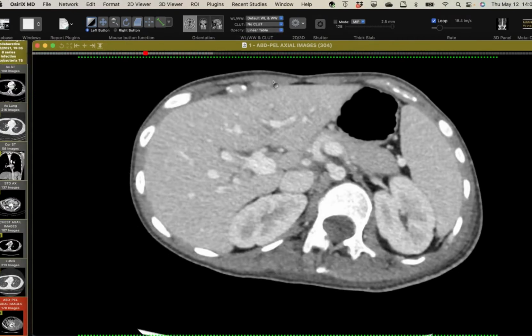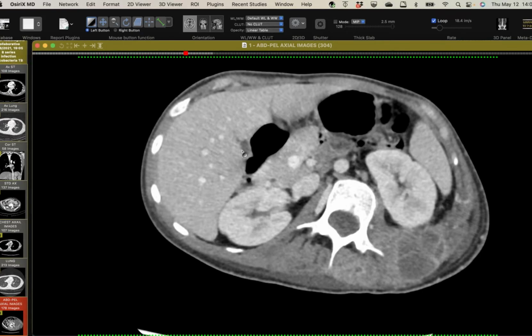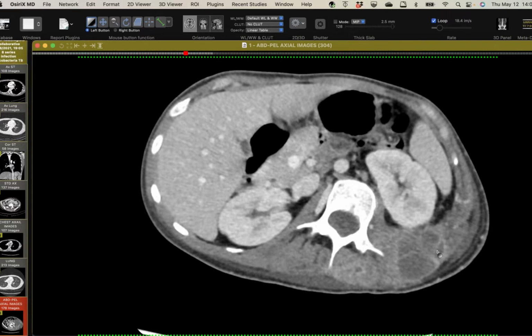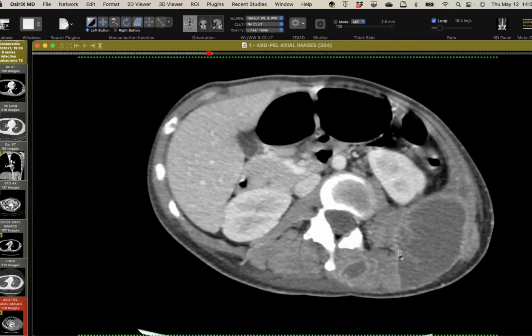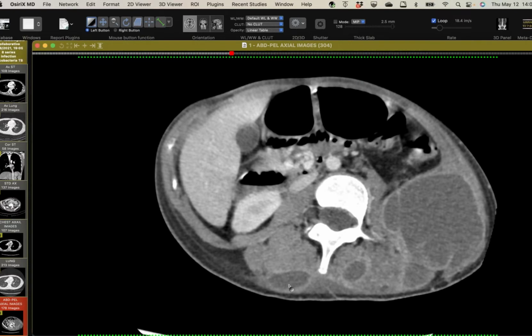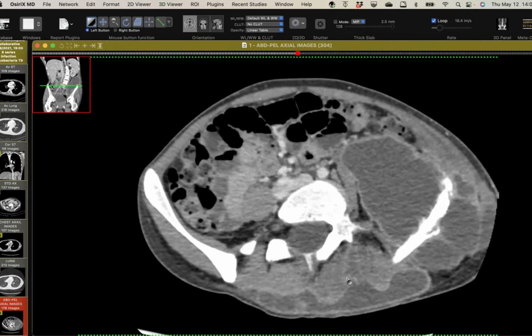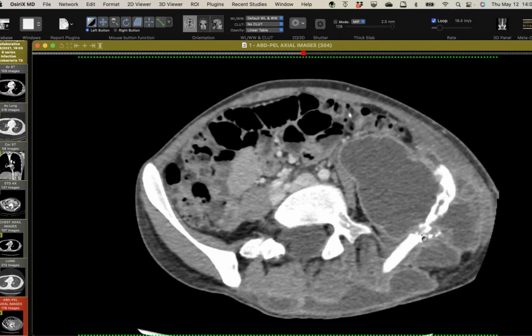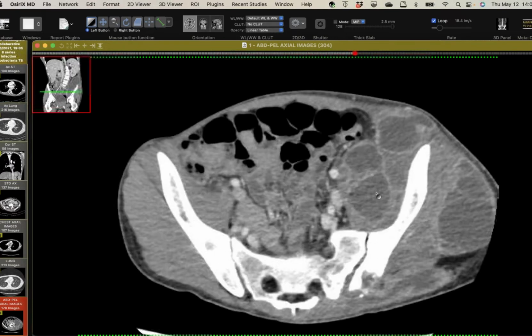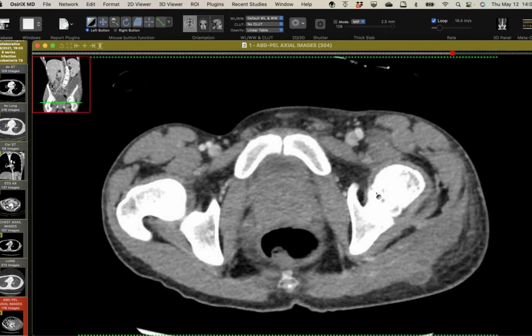a lot of swelling and pain in his flank and lower pelvis. And you can see on this abdominal CT, there's this abscess-like collection down in the left lower pelvis. You see in the paraspinal muscles, there's multiple abscesses here, and it gets quite big. And then there's some osteolysis as well of the pelvic bones, and then it extends internally as well. So this large collection here.